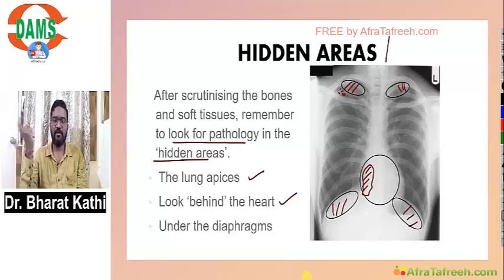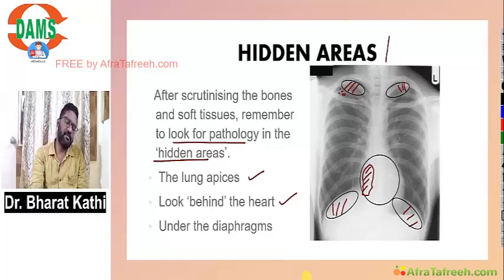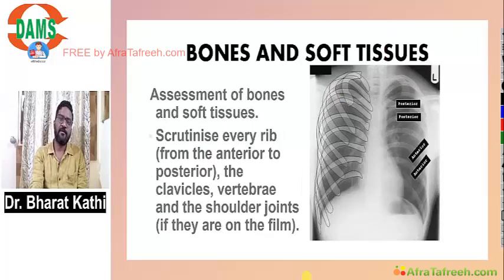Then we did an MRI spine, and it was suggestive of Pott's spine. So that's why be very careful about hidden areas. This a practicing physician should never miss. Then look at the bones and soft tissues.